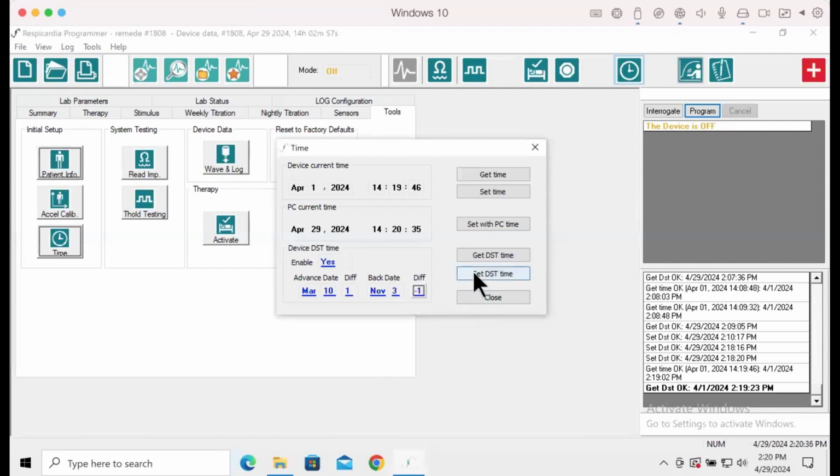Additionally, you have the option to schedule planned travel adjustments for patients across different time zones. Before proceeding, it's essential to configure the dates and the destination time zone for the patient's travel. For instance, consider a patient in the Eastern Standard Time Zone traveling to the Pacific Standard Time Zone on April 5th and returning to the Eastern Standard Time Zone on May 3rd.